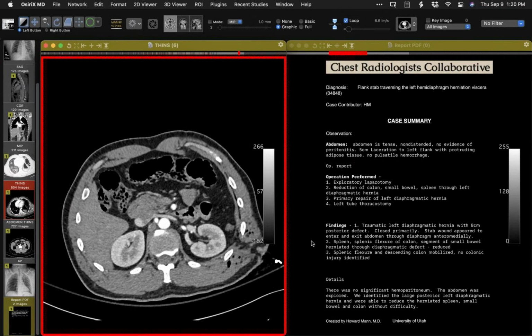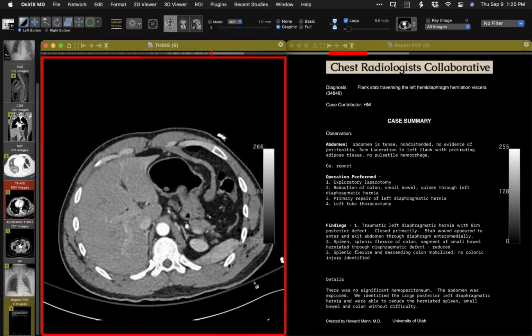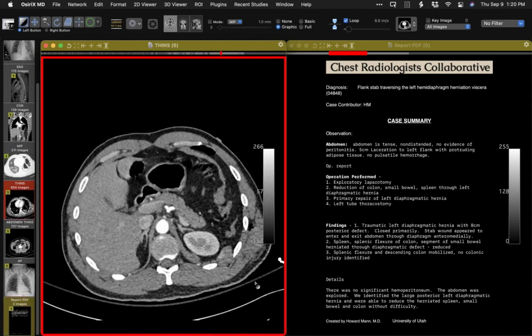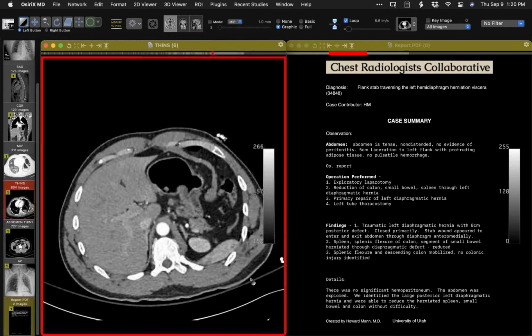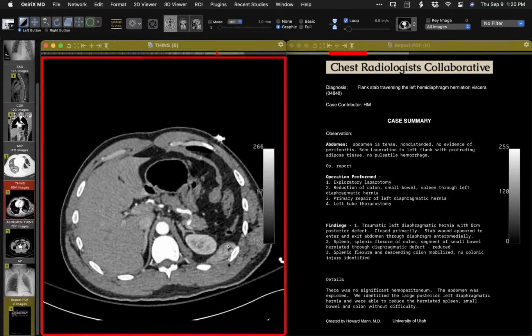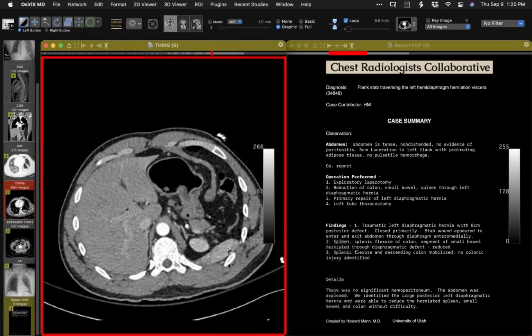It's very lucky that the knife didn't do too much damage to other things, as you can see there. But pretty impressive diaphragm. I suppose if you have a knife going through and it's a certain size, maybe the muscle fibers retract away under respiration and the defect just opens up and becomes rather large. Has anyone quite seen that before? I guess it's not that unusual or unexpected that the defect may be quite big, even from presumably a small knife or a relatively small knife.